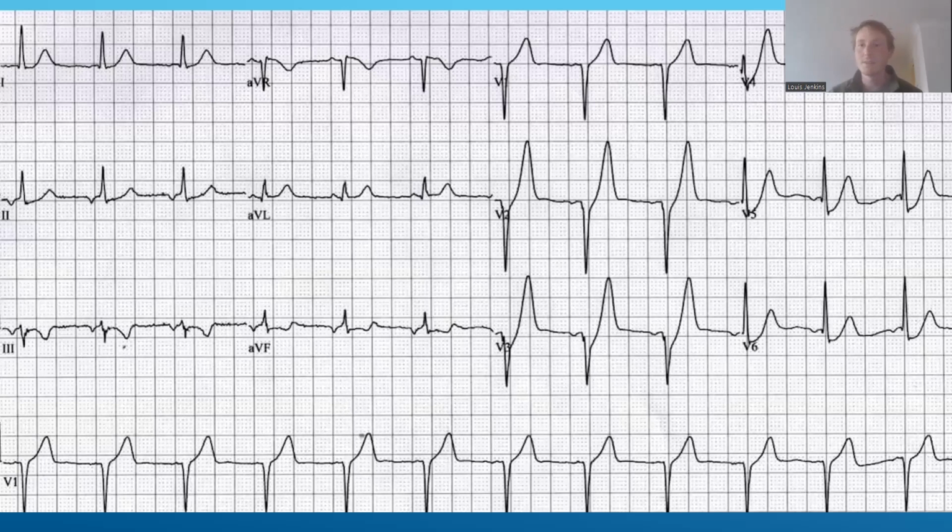And I'm going to force you to have a look at this one because I'm going to go get some water. So you don't need to pause the video. Maybe I'll be back. Okay. I'm going to start talking about it. So if you're still interpreting, pause here. And I'll see you when you're finished. But for those of you who are fast, let's get going.